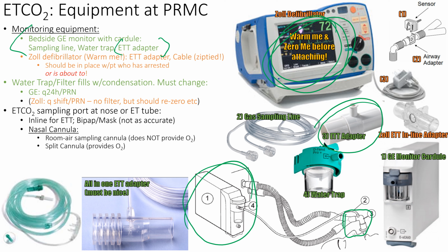If the arrest is more than 2 minutes, you really should have the end-tidal CO2 fired up. If it's less than 2 minutes, you can say, well, it took time, right? So the little water trap right there, they come in 2 flavors, green and silver. The silver lasts like 3 months. The green lasts like 72 hours. It's like, well, my patient fills it up in 1 day, 1 shift. So you can just pop it open and empty it out.